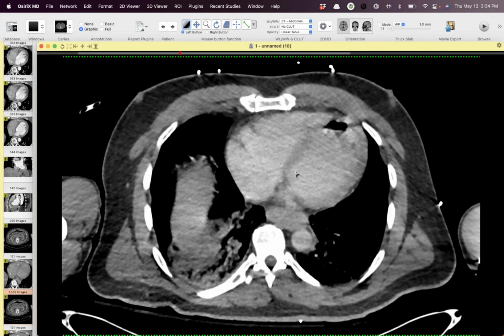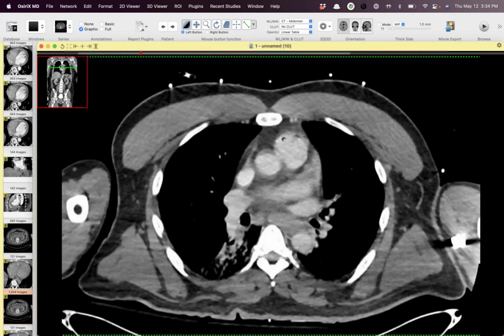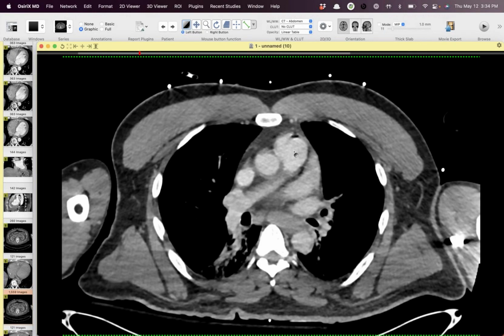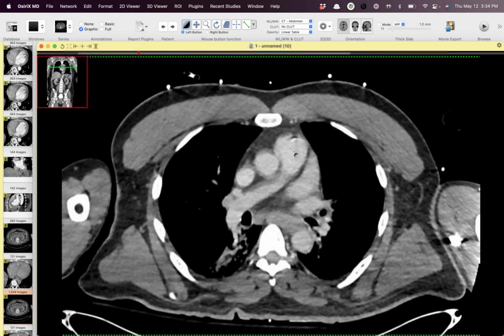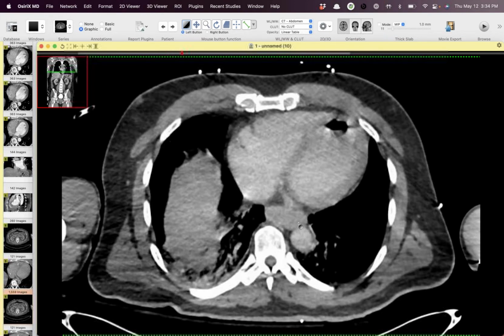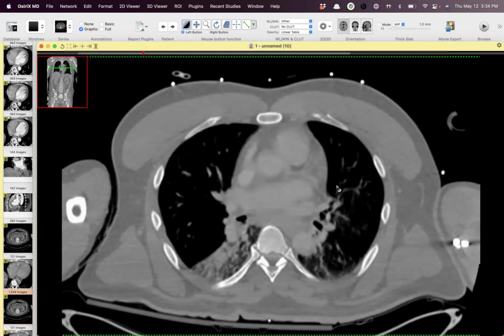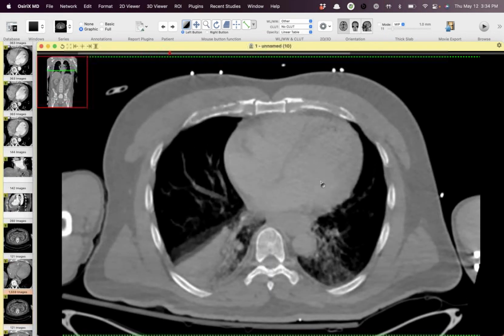Presuming, well, and actually, David, we see it all the time on non-contrast CTs, so I don't even mention it anymore on CTs if it's in the pulmonary artery, because I think most of the time it's probably just from flushing of IVs. Right, for sure. So, yeah, we used to think it was all IV contrast injection, but when I see it on non-contrast patients that have never gotten contrast, you realize it's from something else. But yeah. I don't think they had any air in the appendage. Yeah.